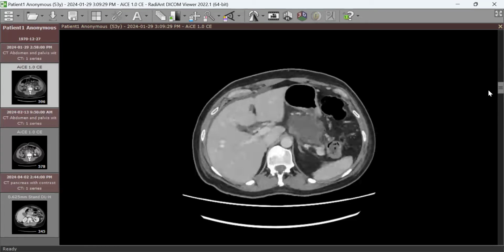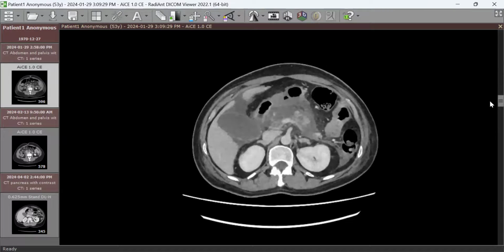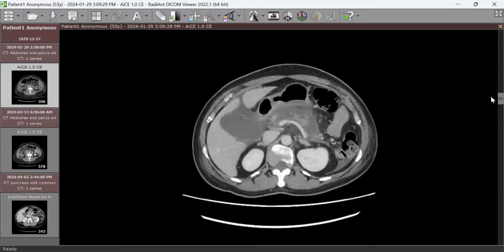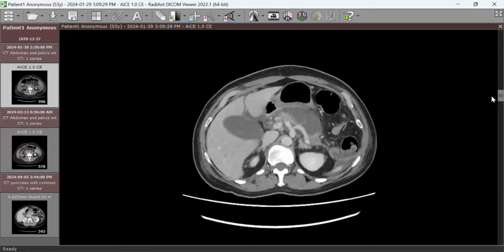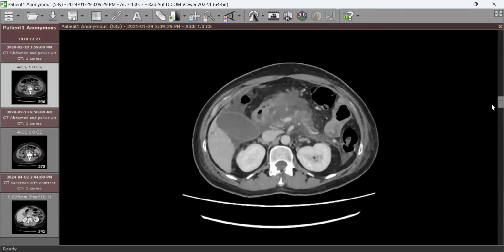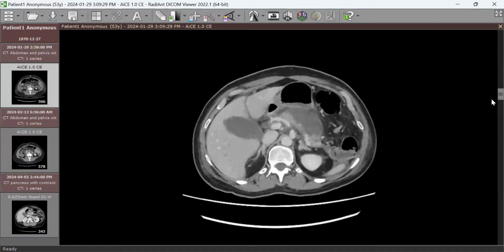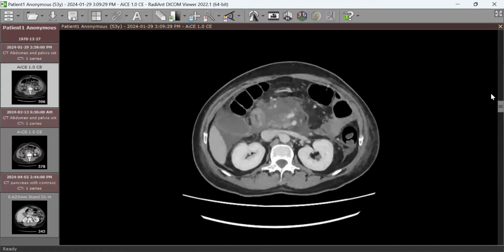And by the way, if there is an abscess, especially after a period of time, if there are gas locules, we can say it is a developing abscess. But otherwise, we wouldn't be able to diagnose abscess unless we aspirate and do analysis regarding microbiology. So other complications now in the vicinity of the pancreas, surrounding the pancreas.